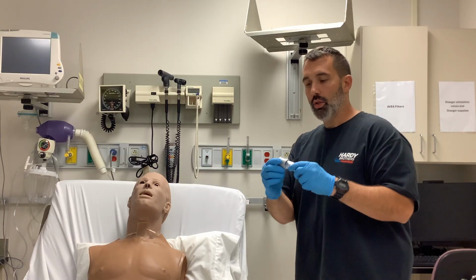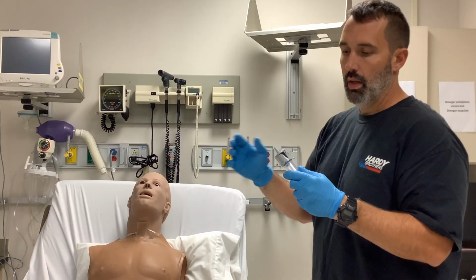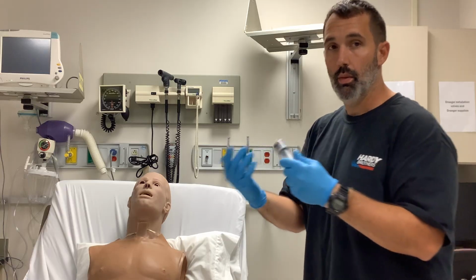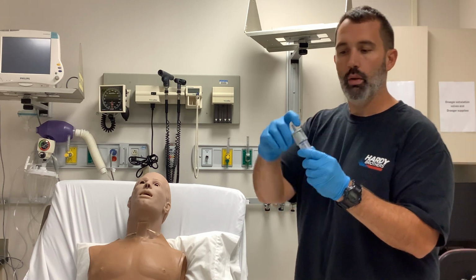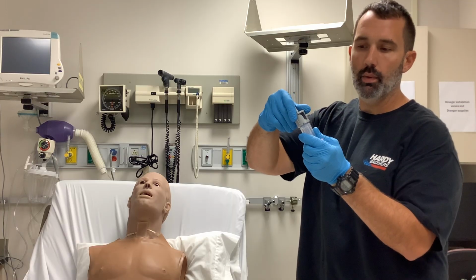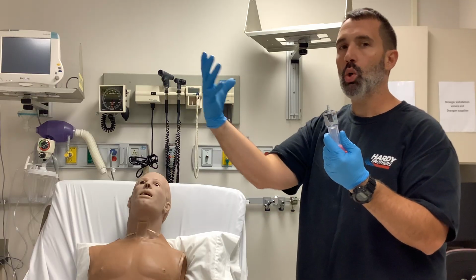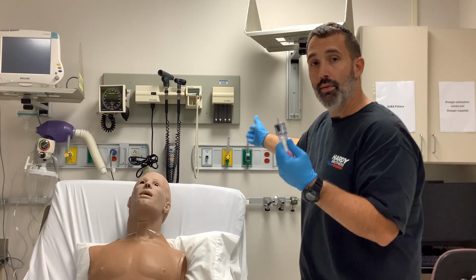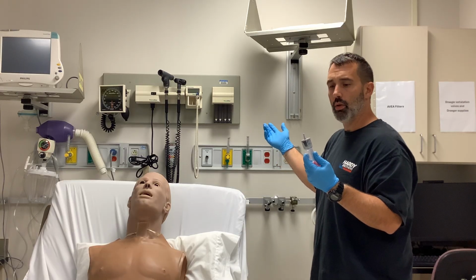But the way that these items work is you're going to attach them to an oxygen flow meter, and then you're going to adjust this apparatus to the desired amount of oxygen that you want the patient to breathe in. So for instance, if I were to set this to say 40%, it's going to adjust this window. The lower the percentage you go, so this one will allow me to go down to 28%, the bigger the window gets. Why is that? Because it's got to pull in more air, 21% that you and I are breathing in, to dilute the 100% oxygen that's coming down out of the flow meter. So we've got to make sure that we are aware of that.